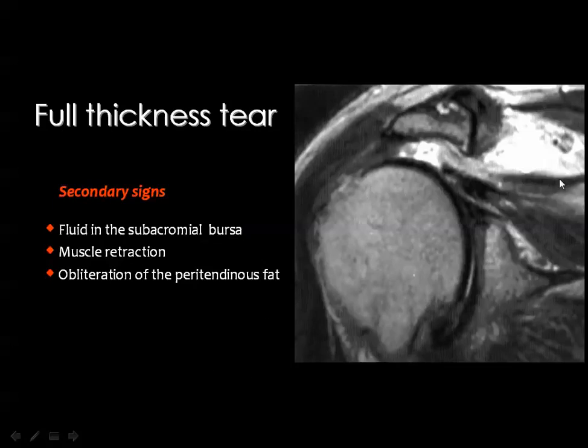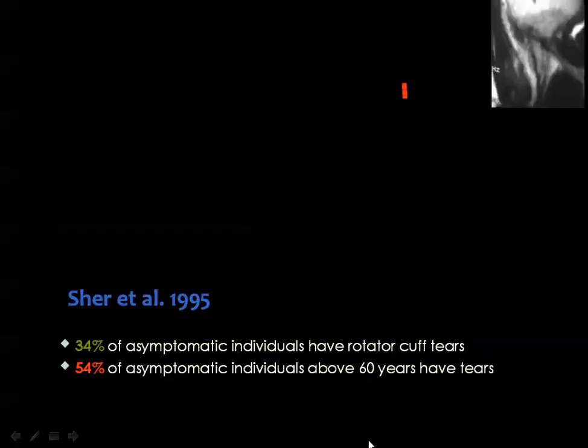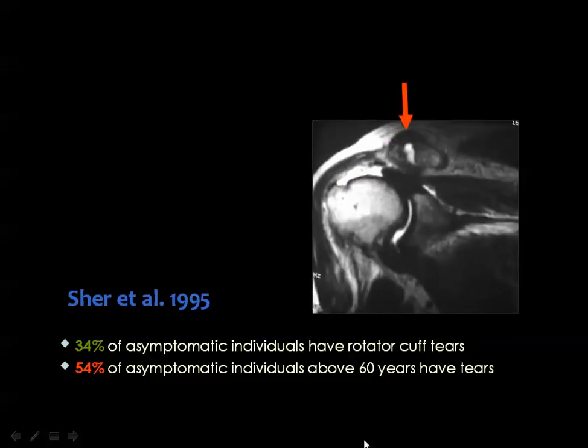And also you can appreciate that the muscle bulk is more or less maintained.